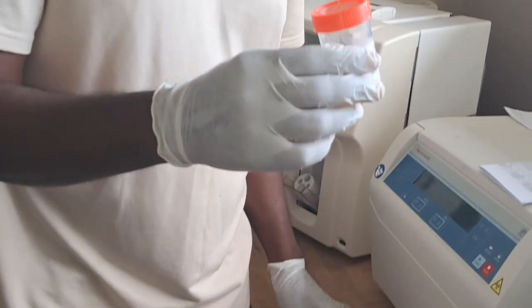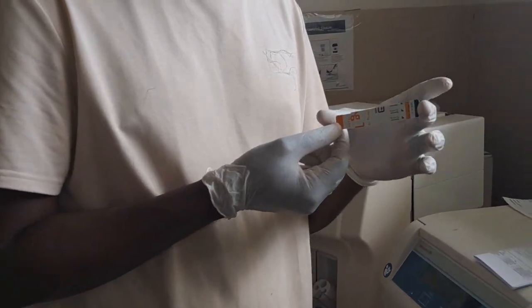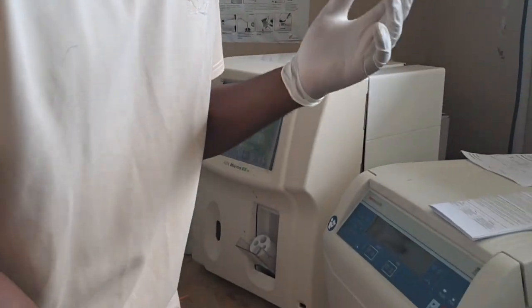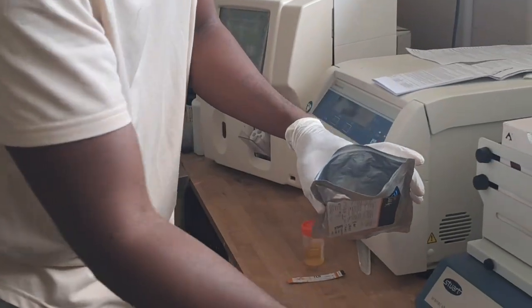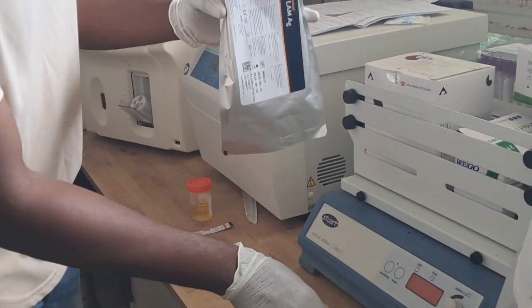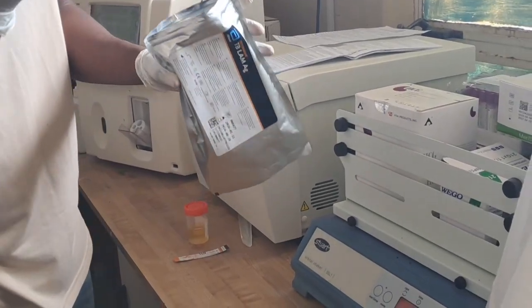Now for the procedure itself. This is our sample. This is our test strip. This is how it looks. We have gotten one, so after getting one, we are doing one test. This routine should never be missed: put everything back together with the desiccant. Don't forget the desiccant.